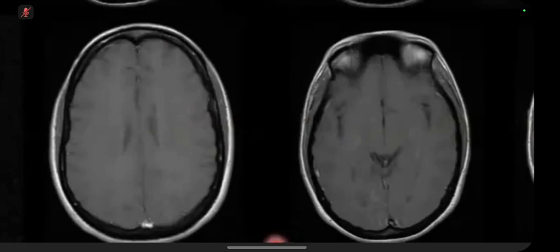Yes, please. Okay, so on the FLAIR sequence, I can see periventricular foci of high signal bilaterally. I can also see more confluent areas on the third image on the top row, which demonstrate restricted diffusion.